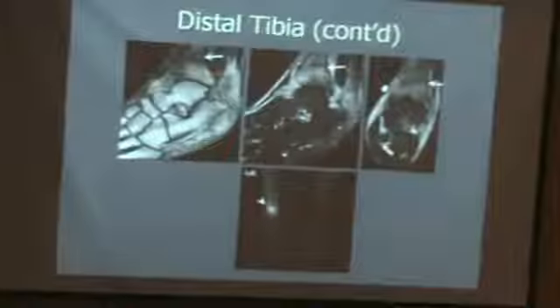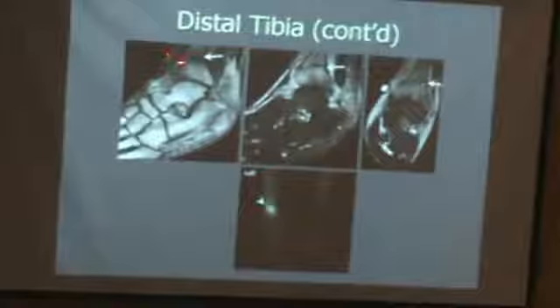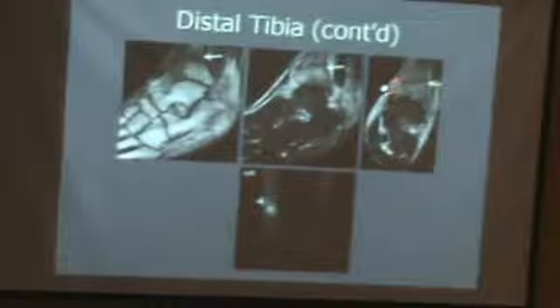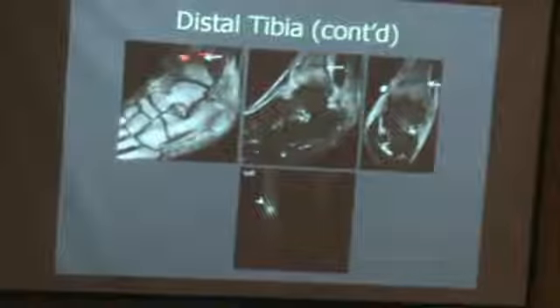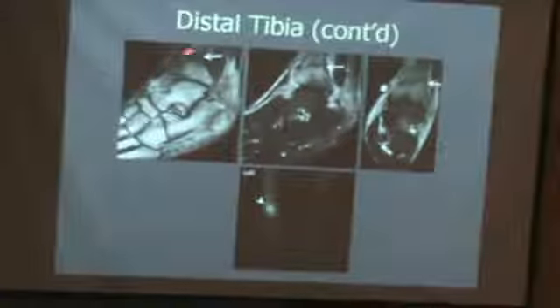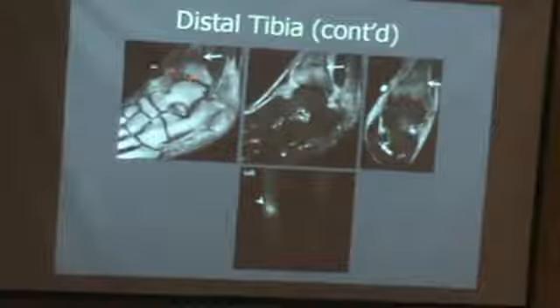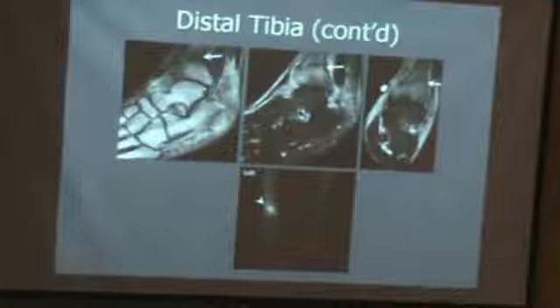And when you look at the MRI, on the T1 weighted image you see that subtle, small periosteal reaction turned out to be a very acute line of fracture. Again, this is really the best image that you can get, a T1 weighted image. And on the T2, you see the extent of bone marrow lesions, so a lot of acute edema in the bone marrow. Also, the bone scan shows you the same fracture.